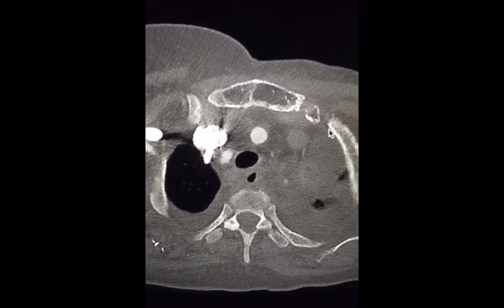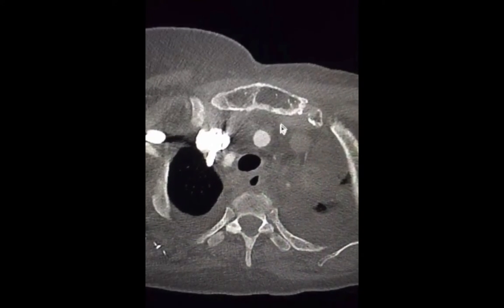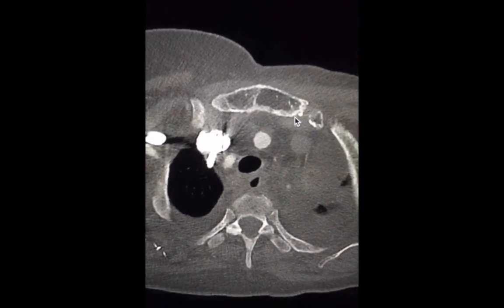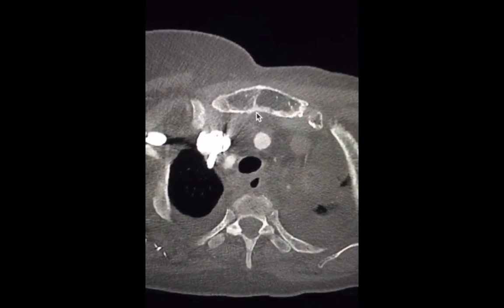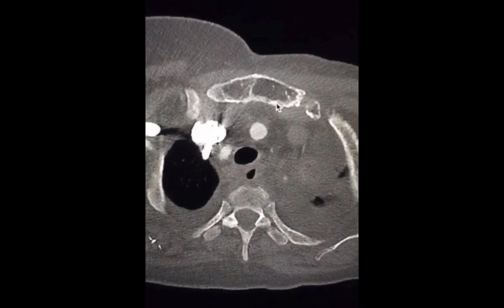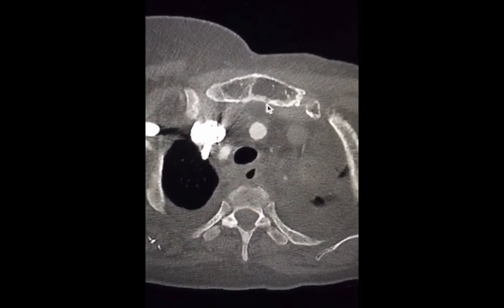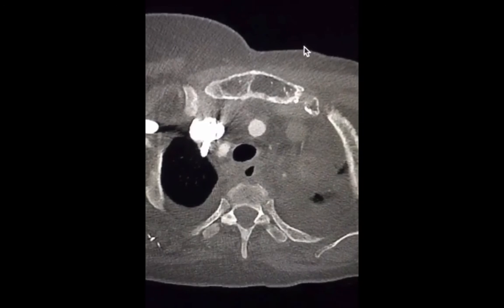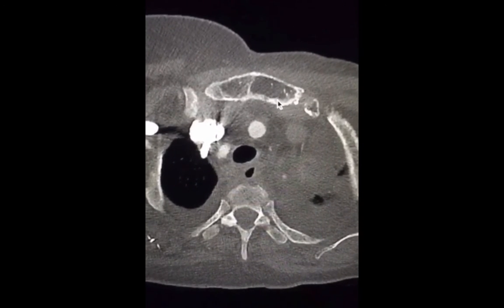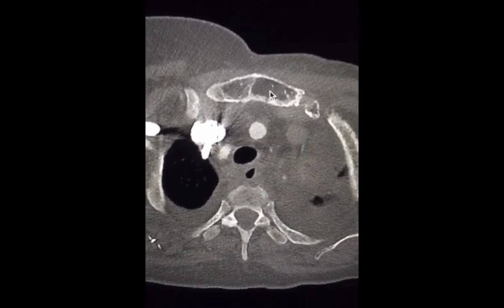There are various manifestations of radiation-induced bone changes. Long-standing changes, such as what we see here, are well described. These may include bone expansion, cortical thickening, periosteal reactions. Even coarse trabeculations with radiation have been described, which is something that's absent here.